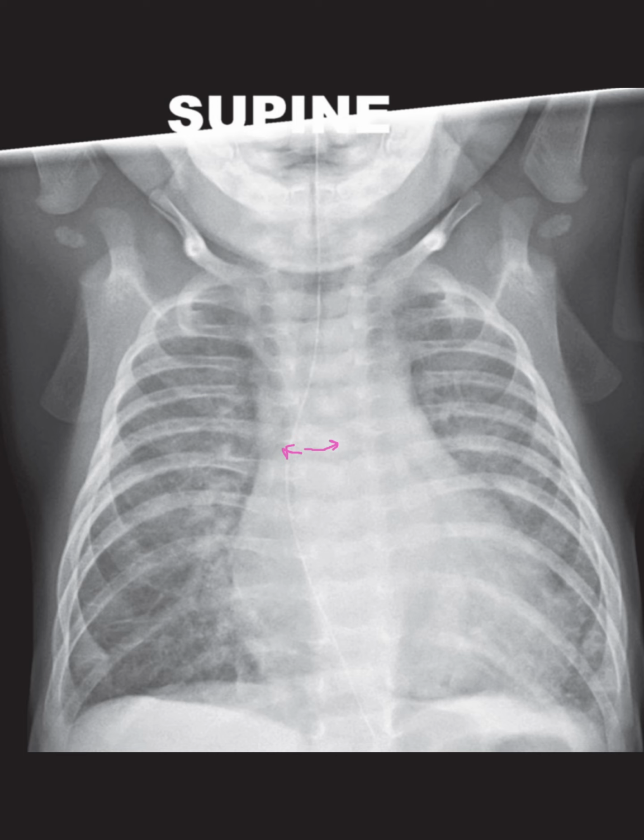While these could be due to an infection, in the context of the other signs, they more likely represent interstitial pulmonary edema. These observations make me consider that we might be dealing with congenital mitral valve disease. I'd recommend discussing this with the referring clinicians, and a follow-up assessment with echocardiography would be crucial to further understand the heart's condition and function.